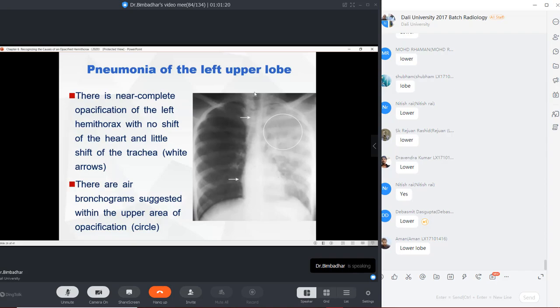Once again, right? And also you see here, when compared to the lower parts of the lungs, I can see there is an increased opacification on the upper lobes. This one is a little bit grayish in color, but this one is much whiter in color, which says that there is an air bronchogram pattern. I can also see the trachea that is present here.